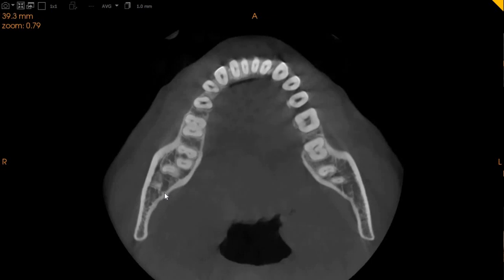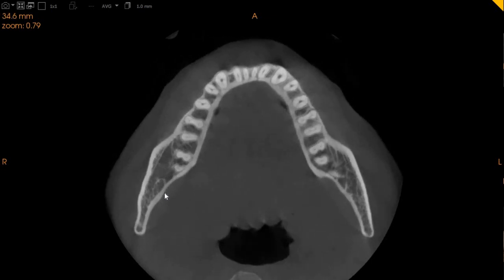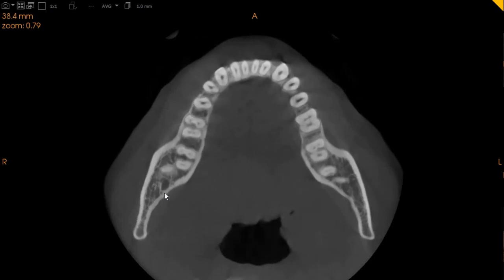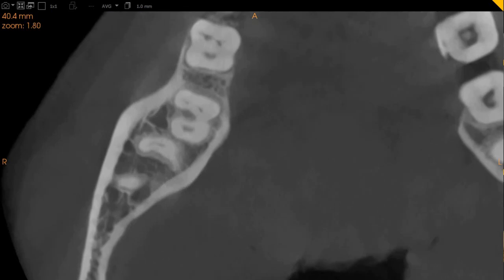It's slightly lingually placed, travels interdentally, and then is still lingually placed. The mesial root is fine, the interdental area is fine. The distal is where we can actually see that the nerve is quite significantly close right there. So caution needs to be practiced when extracting this lower right wisdom tooth.